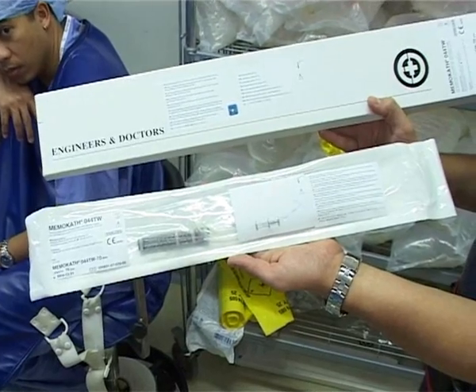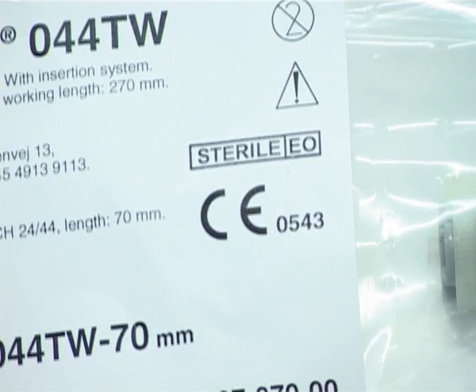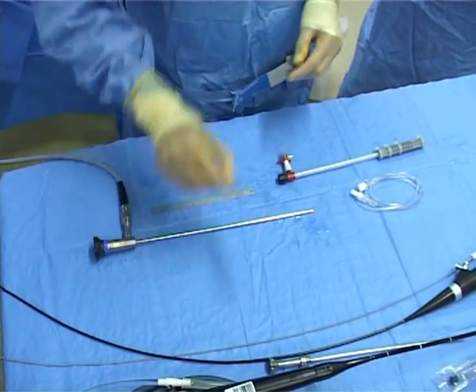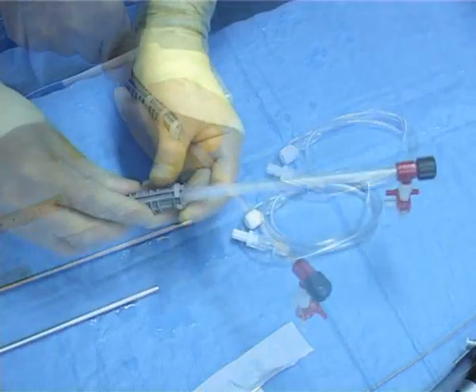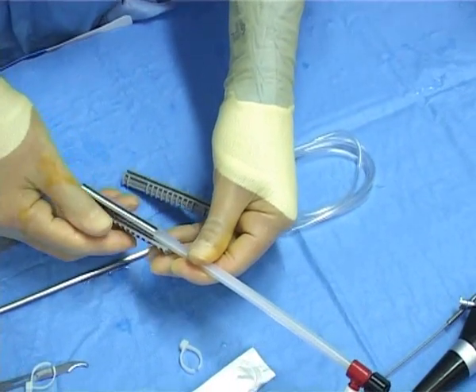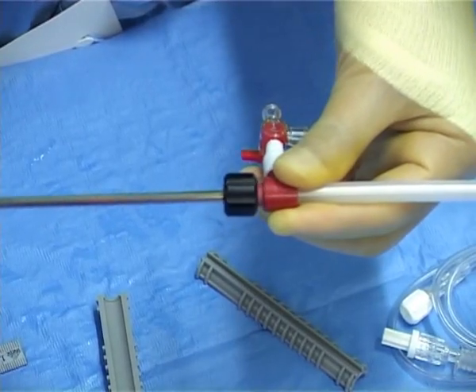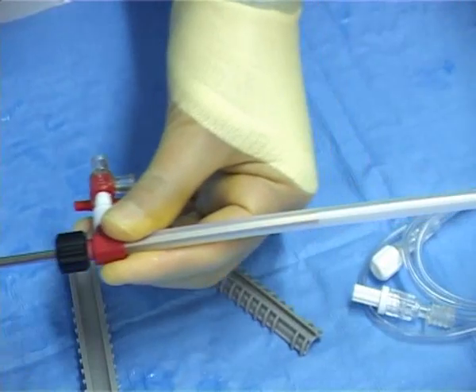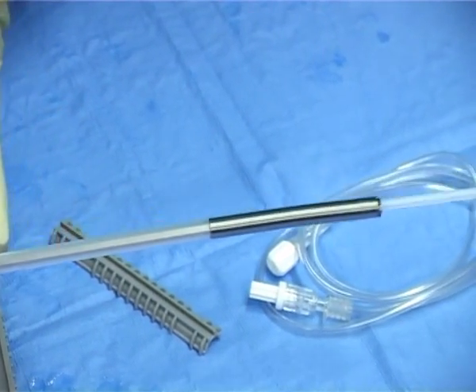The Memocath kit consists of the stent mounted on an introducer. The protective casing is removed with the scalpel provided, cutting the plastic bands away from the tip of the stent. The assembly can be mounted on a standard cystoscope, whereby the inner plastic core is gently pushed out.